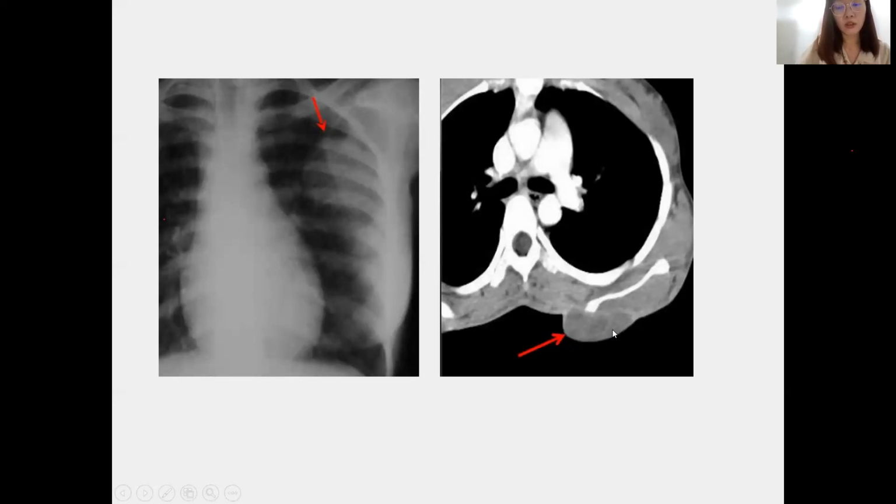So always, projected on frontal X-ray, it looks like opacity within the lung, but on CT it is external to the lung. This must be borne in mind. But these are less common causes, and also we can diagnose it correctly because we have clinical history. But if not, then we will just say left upper opacity here. Okay.